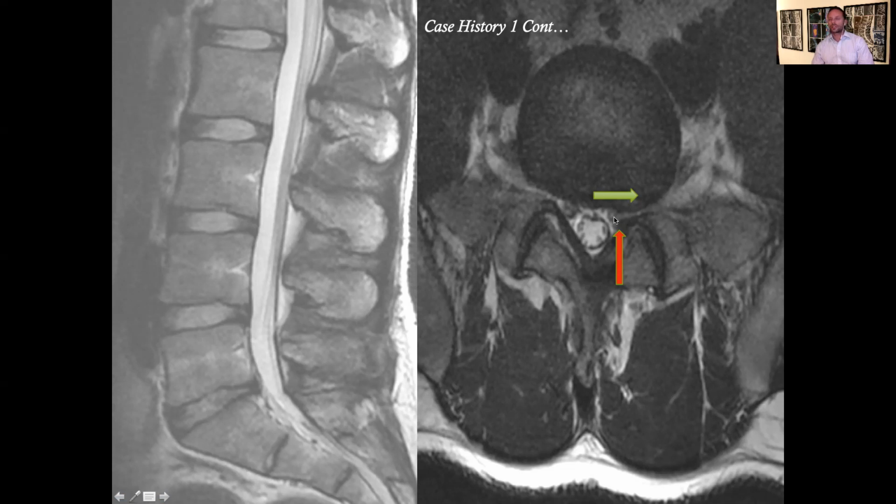Now, I just wanted to share that with you because it's something that I see on a daily basis. And if you're not proficient in looking at the scans yourself, you could go on, maybe like the other therapist, to do 8 treatments working into the piriformis muscle to relax it, to reduce the compression, when actually the compression was higher up.